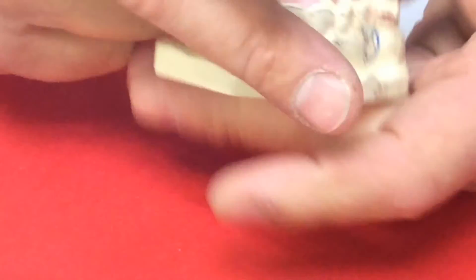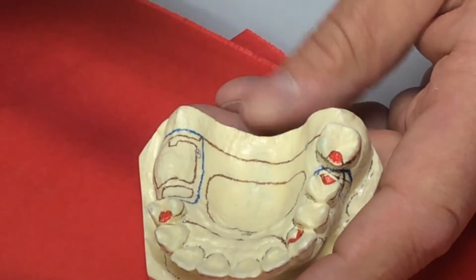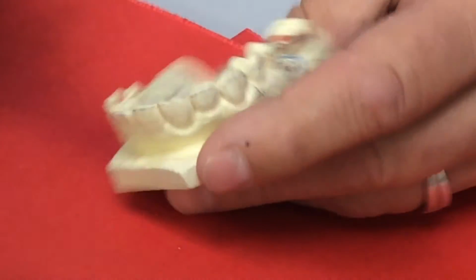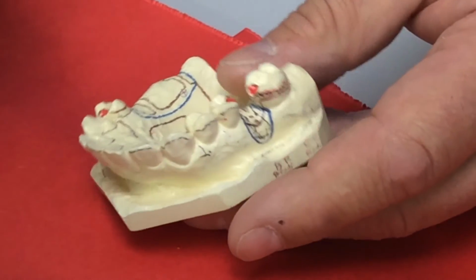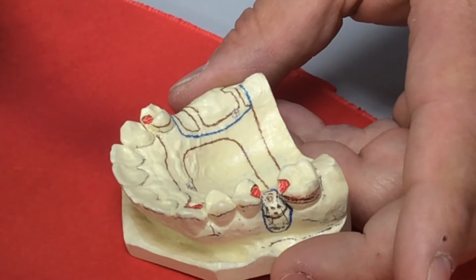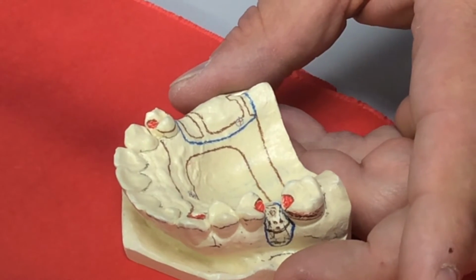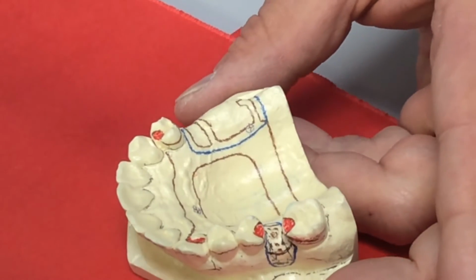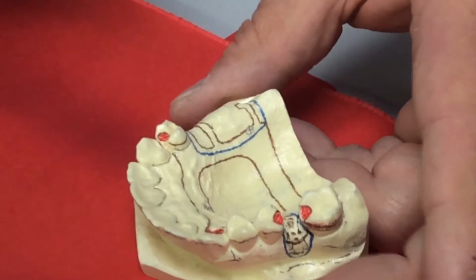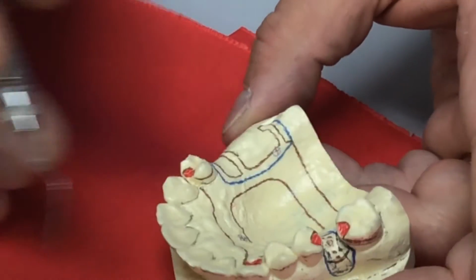All right? So after we've established the tilt, I'm proud to say that every single one that I graded did not miss putting the tripod marks on the cast. Absolutely none of them that I graded missed marking the height of contour. None of them missed marking the rests. None of them missed any of those first grade steps, which is really good because I don't think that's ever happened when I've graded this before. So you all remembered those steps, and that means you had your rubric out and you looked at it, and so to me that's good.